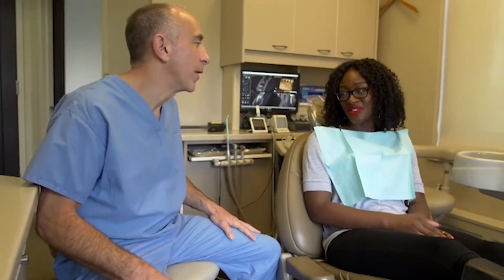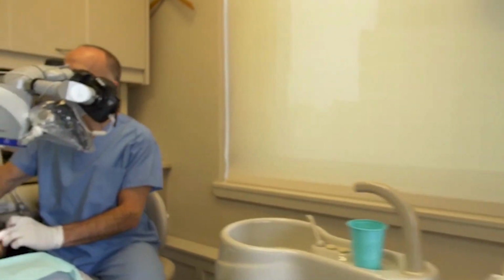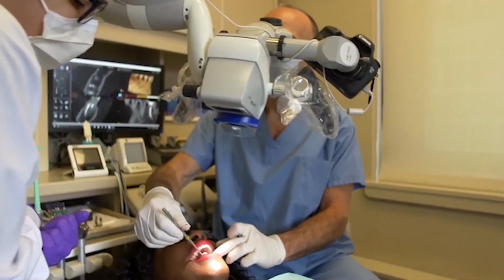Today's patients have higher expectations and are more knowledgeable. And as clinicians, the more we know, the more responsibility we have to give them the treatments they deserve.